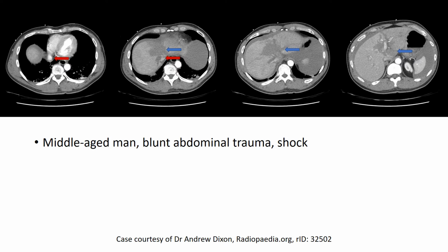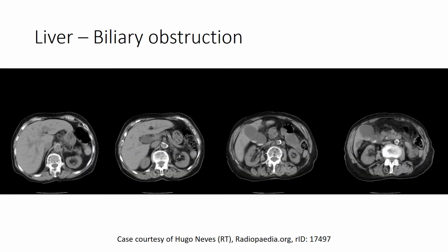The laceration also involves the left portal vein, as seen in the 4th image. So given the extent of vascular involvement, this likely represents a grade 5 liver laceration. There's also a significant volume of blood seen around the liver and spleen, likely representing hemoperitoneum.